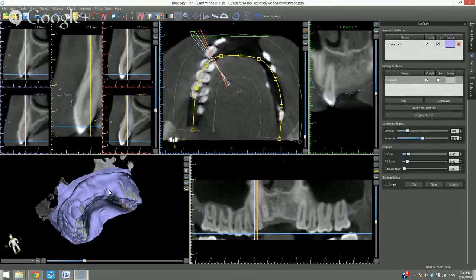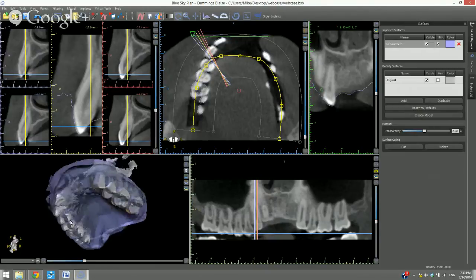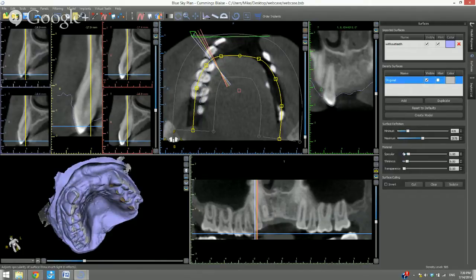Another option that we have is to use our transparency setting, and we can visualize in the 3D that everything seems to be aligned and is in position. We could change the transparency of the model. We could also change the transparency of the CT scan, and we could check that the edges, the points, the cusps all seem to be lined up and done properly.